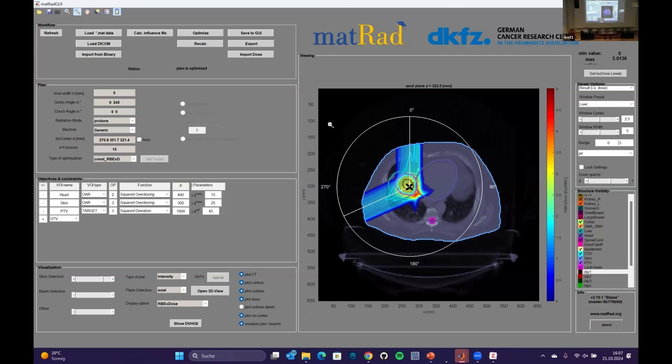Okay, good. Now, for the final interactive part that we can do, let's switch to carbon ions. You can very easily switch to carbon ions as well. We can use the same gantry angles for carbon ions. If you did this exercise with me, just click auto again next to the ISO center. So it hopefully will reset itself at some point. No, it doesn't want to reset itself right now. Why doesn't it want to do that? Let's try it.